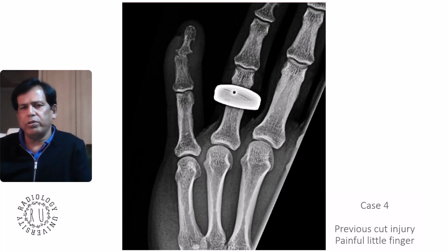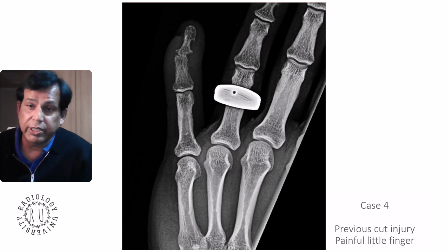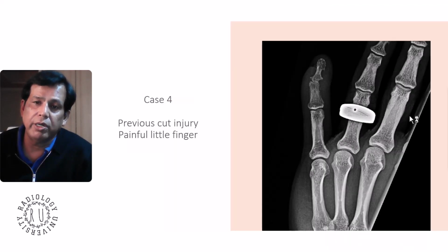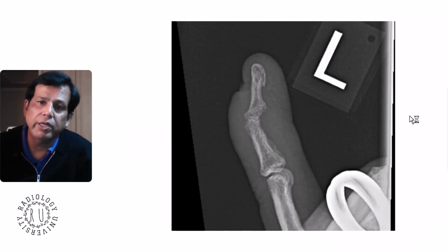This loss of joint space will all lead to secondary osteoarthritis in the end. But this is a septic arthritis, and given the history, if it is acutely swollen, then you can do an ultrasound scan to see whether there's any fluid to aspirate, or do a blood test to see if the CRP is high, the white cells are high, and things like that. These all lead us to say that the clinical picture is more of infection. This is septic arthritis.